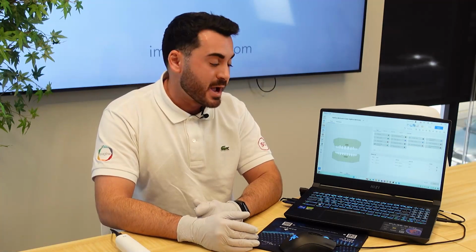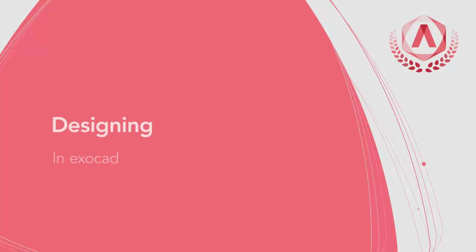Once our case finishes processing, individuals can then take that STL file and decide to either send it directly to a lab via Medit link, or you can then bring the STL into exocad to complete your own duplicate denture design. In the next part of the video, we're actually going to be taking this file and bringing it into exocad and showing you how to complete that design for a duplicate denture.